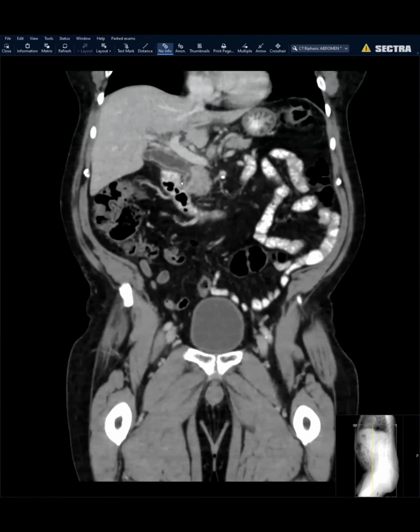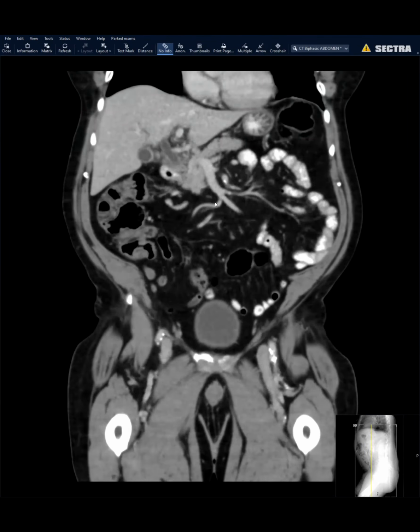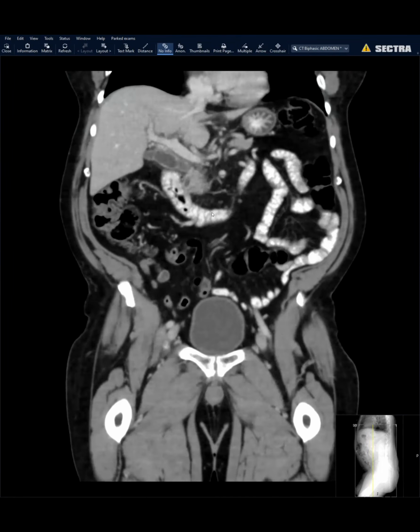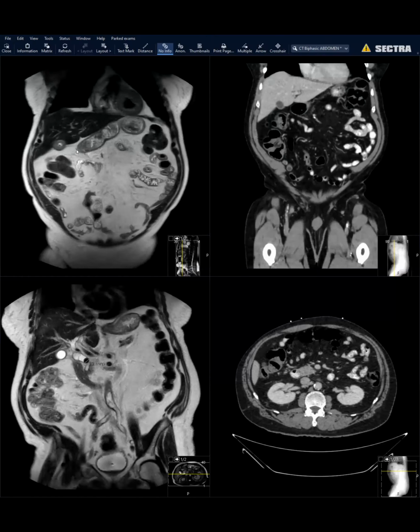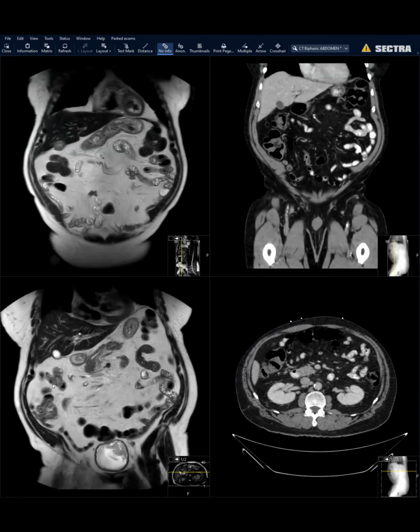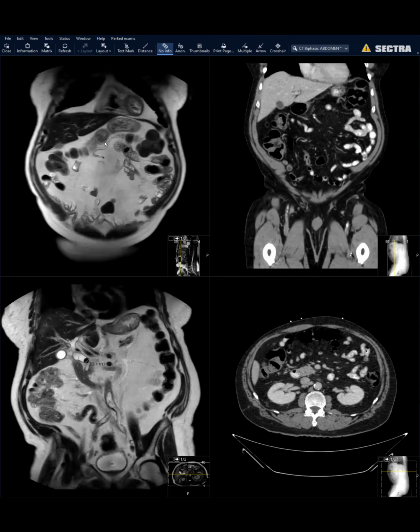Without a stone being seen, I think the critical finding was the abrupt transition, right at where the cystic duct inserts. That's an awesome call. The gallbladder looks interesting to me on those two MRs, and it makes sense that the gallbladder here is not getting distended, because it looks like they have chronic cholecystitis, which looked more dramatic previously, but the cystic duct is so distended while the gallbladder is not. So it must be because the gallbladder wall is fibrotic. Fibrotic, exactly. Yep, that's right.